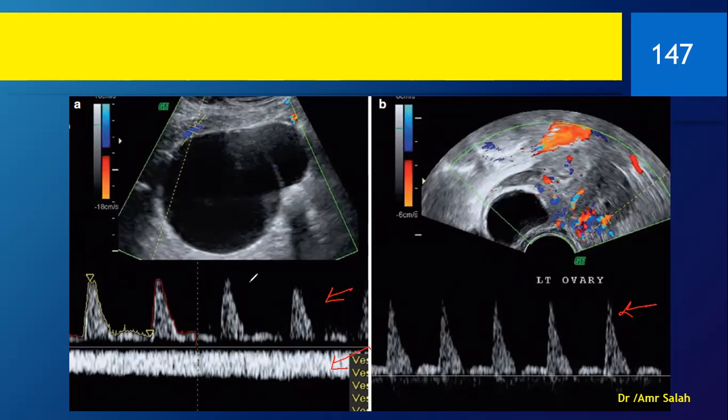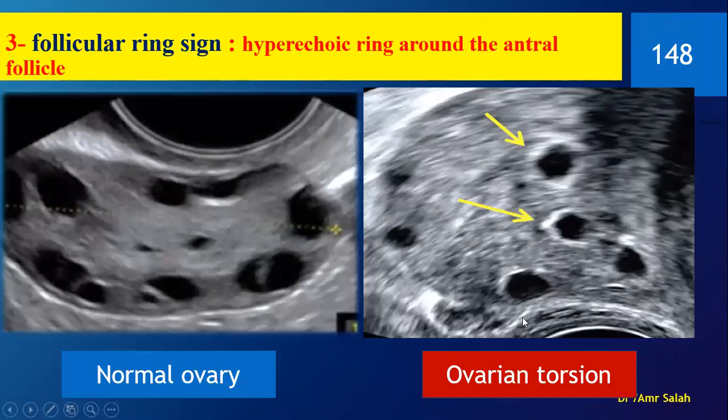Although this one has the cyst, this one has the torsion. And it would be supported by her having pain in her left iliac fossa. Then voila, this confirms it. The patient must have clinical symptoms. Along with these ultrasound signs, of course, the Doppler findings are specific. The ovary being enlarged and heterogeneous is all non-specific, but along with the clinical data, I can readily suggest this is torsion.